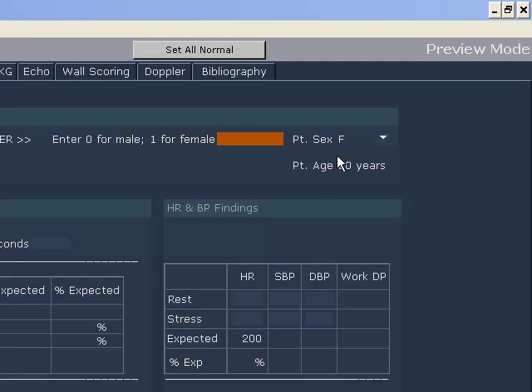You'll see that the patient is a 20-year-old woman in this case. Although the system knows that it's a female gender, that cannot be used with this current version of Syngo in calculations. Predicted METs or predicted exercise times is gender specific, so I created equations that can take into account patient gender.